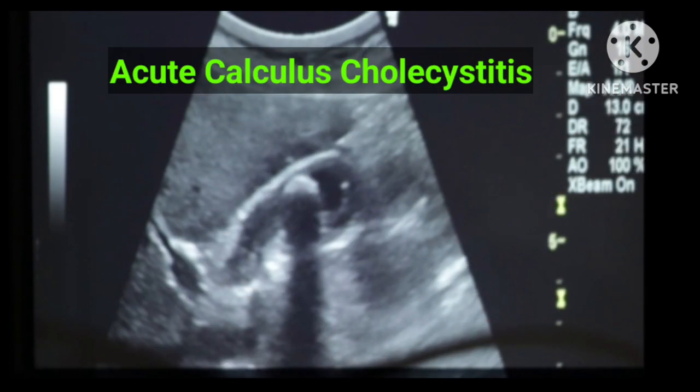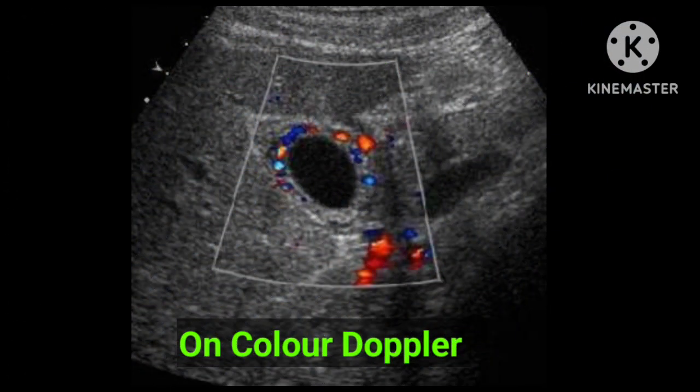This slide of acute calculous cholecystitis shows a gallstone with posterior acoustic shadow, pericholecystic fluid collection, and sandwich appearance of the gallbladder wall. This slide on color Doppler shows increased vascularity of the gallbladder wall, which is in favor of inflammation.